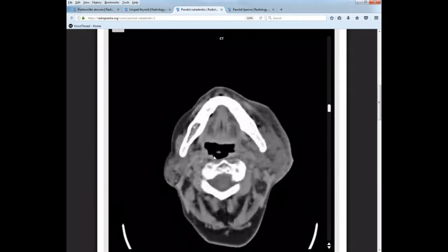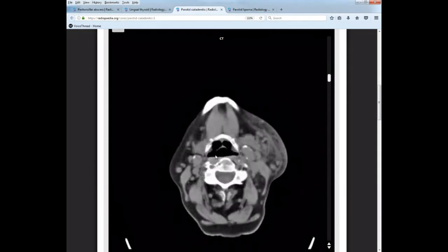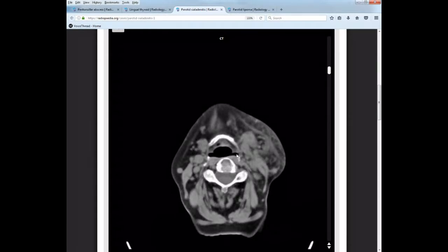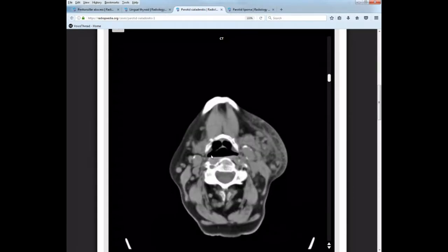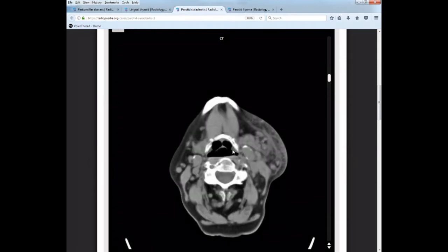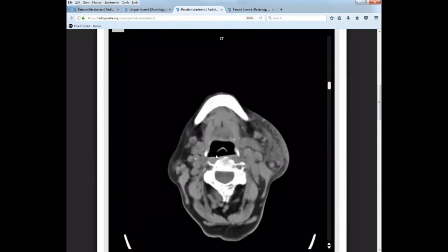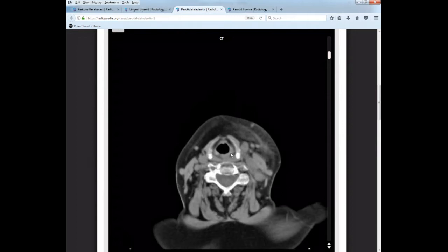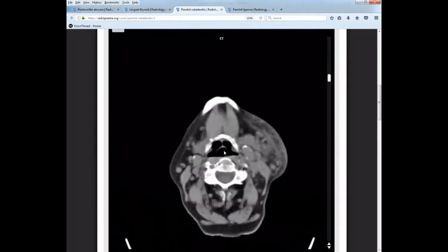Oh, sorry, I went the wrong way. Coming down, coming down. There were your piriform sinuses here. Okay, so not as easy to see on this one, but when you see the epiglottis, the two openings or pouches anterior are going to be vallecula. The two posterior are going to be piriform sinus. Okay? Down into the trachea.